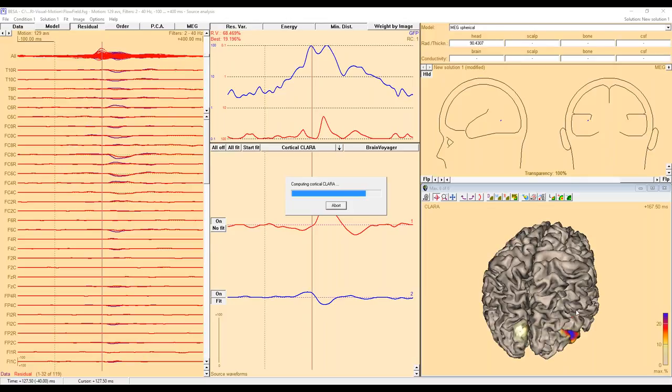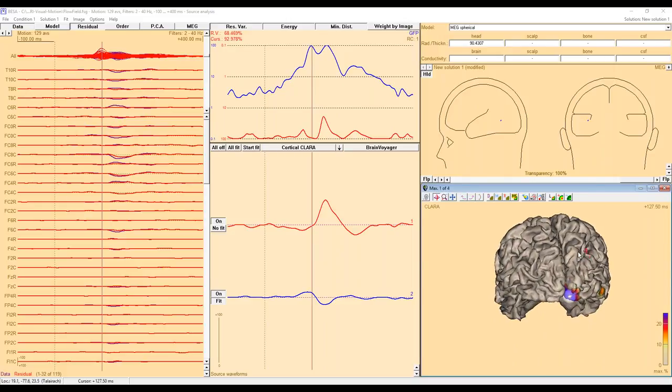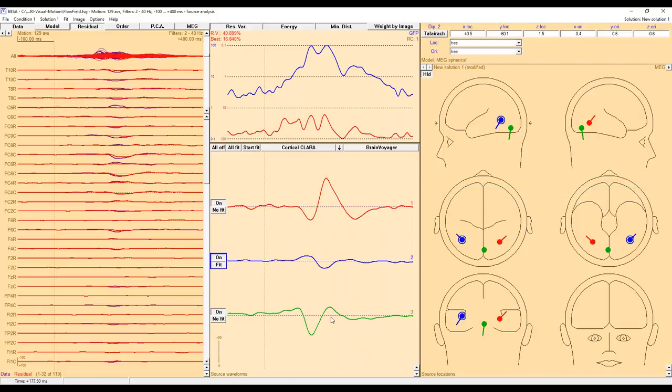So let me go there. Okay, and have a look at the maxima here. The first maximum should actually be right there, correct. So let me see another source here. And this is a very basic model that I've now created that explains my data actually quite nicely already.